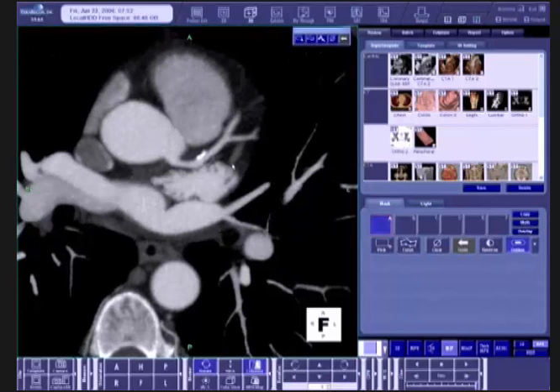Now, before we begin the review, let's discuss a little bit about coronary anatomy. The important thing to appreciate is that you're going to be navigating basically on the globe, and the coronary arteries can be found in your left hand.